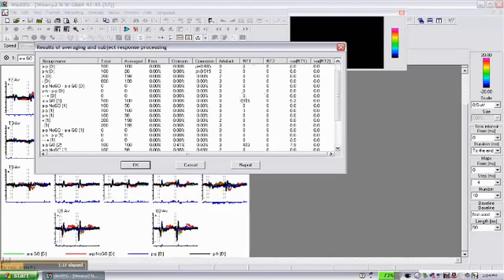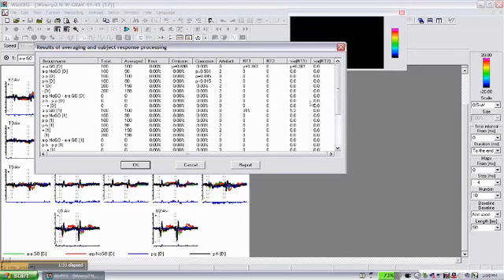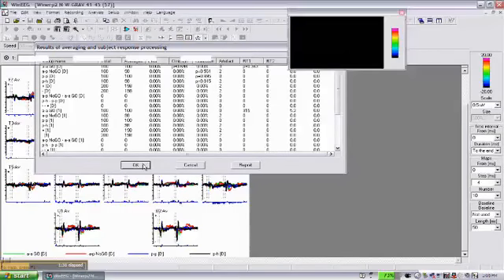P-value for reaction time is also normal. As you can see, the reaction time for this subject was 350 milliseconds, while in normal population just only 400 milliseconds, so he reacts faster than in norms. Variation of response is also smaller than in norms, so all behavioral parameters look quite normal.